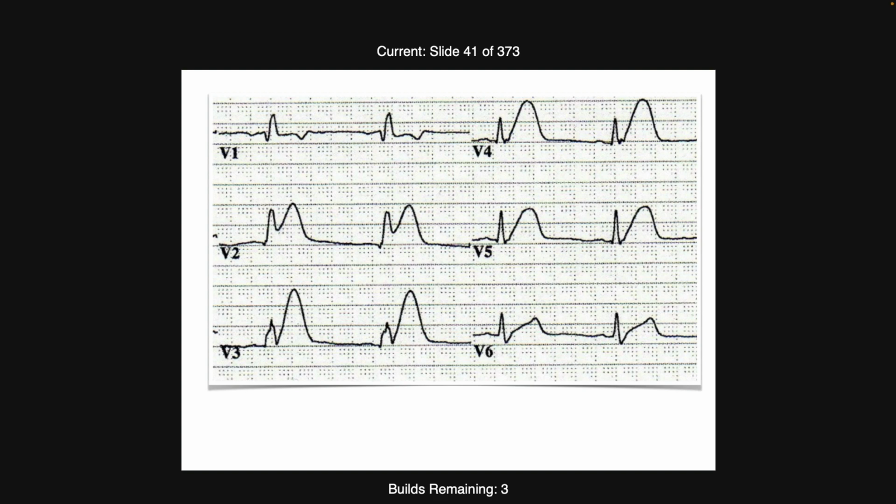And what we pointed out before was V3, V4 maybe, and V5 by our old definition doesn't fit, because this isn't 10 millimeters. But if we use our new definition, this one easily moves into here, that one easily moves into here, and this one just about moves in.